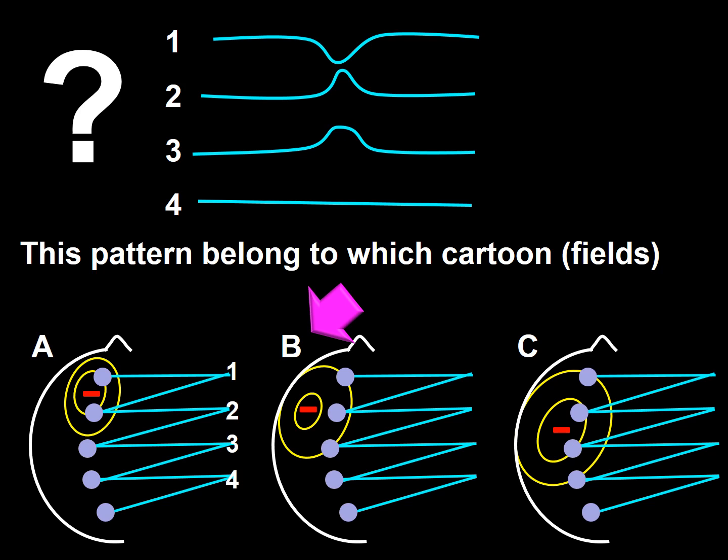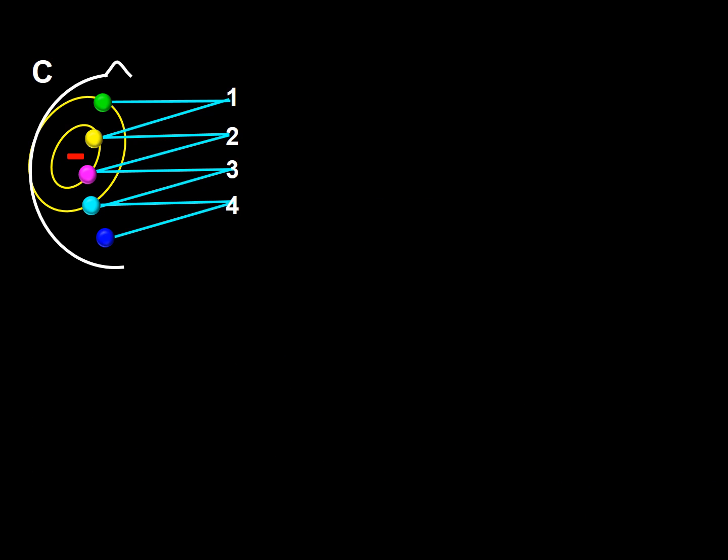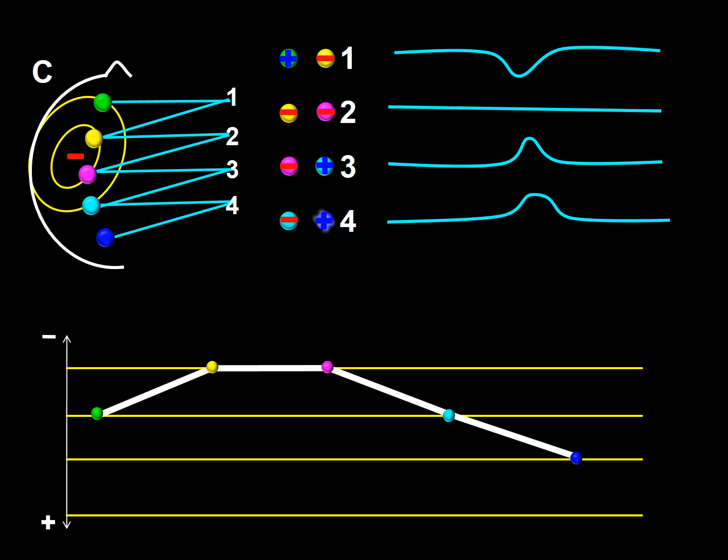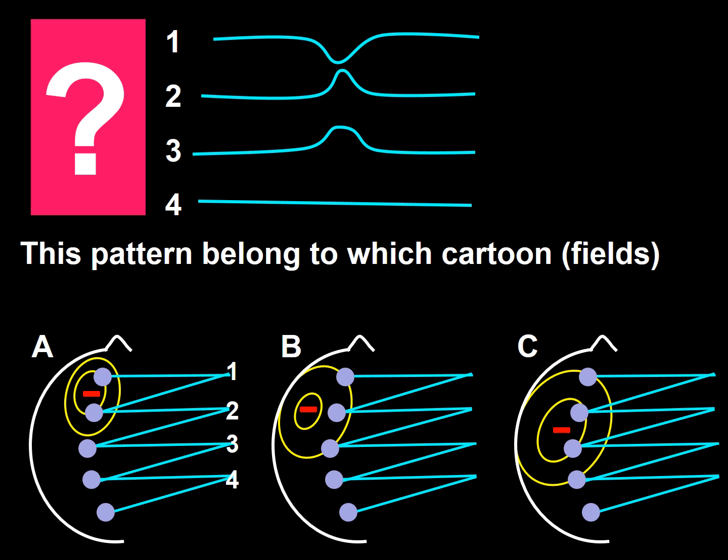Once sample B is analyzed, we do the same thing for sample C. We look at the voltage isopotential map. We develop a voltage graph following the previously stated order and produce the corresponding epoch. So the answer to this question is B.